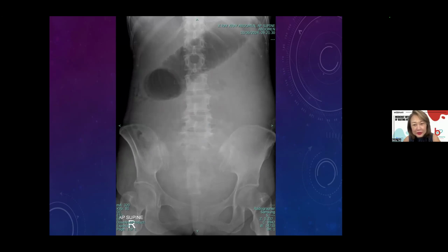Intussusception? No. Yes, valvulae conniventes. So when valvulae conniventes are present, what does it mean? Is the bowel loop dilated or not dilated? Valvulae conniventes is the small bowel fold. Okay, so anyone? Guys, this is a small bowel obstruction. Yes, correct, everyone. Thank you for the answers.